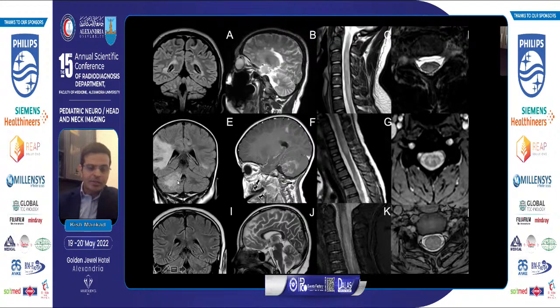If you have lesions, big lesion load here in the posterior fossa, the cerebellar peduncles are involved, you've got cortical, subcortical changes, punctiform enhancement, irregular enhancement, and on your cord, you've got longitudinally extensive disease, and it takes the central cord. And also, let me add here that the conus medullaris is typically involved. Think about MOG.